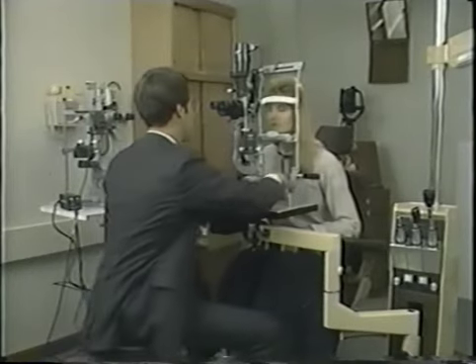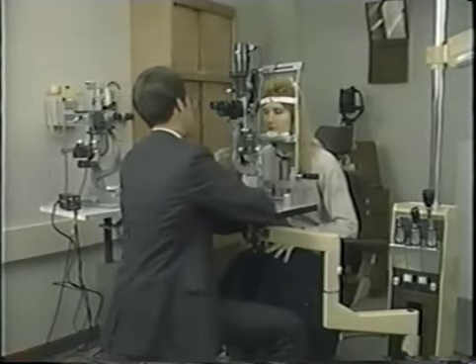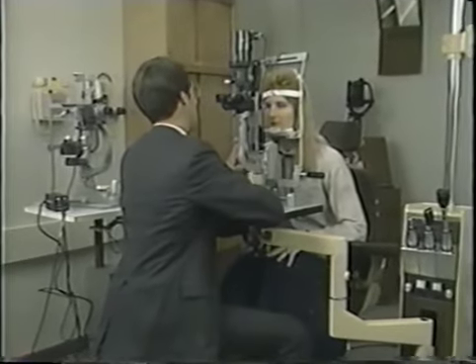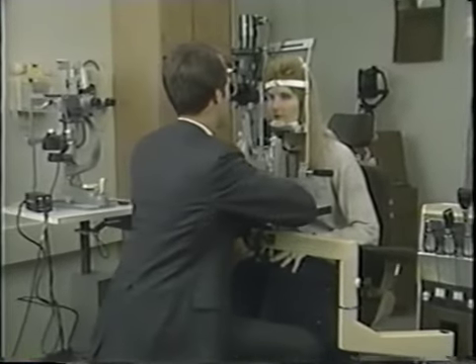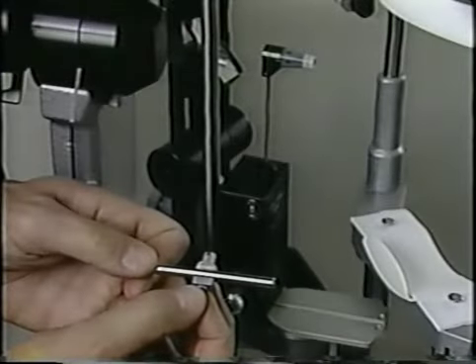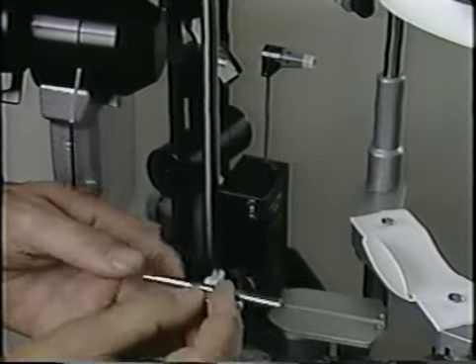Finally, some of the difficulties encountered in the routine, uncomplicated patient may be due to improper calibration. Thus, it is important to periodically calibrate the tonometer every other month. This is done with a short rod of measured weight which is inserted into the housing of the tonometer.